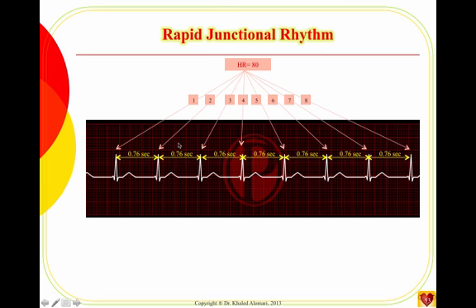Now that's really not common and it's hard to identify. So as you see, every time the heart rate is faster, it's hard to see the inverted P. So I will make sure that the rhythm has the inverted P. Now, the other arrhythmias that have to do with the AV, there are three of them, or four actually.